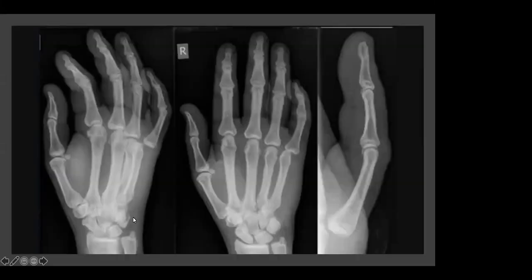So again, here, I'm not sure how well it projects on your screen, but we're looking at an example of joint dislocation. So this is a plain radiograph with 3 different views of the right hand. And if you look at the 5th digit, there is joint dislocation of the metacarpophalangeal joint of the 5th digit. And again, it highlights the importance of why multiple views are required. It's much more emphasized on the oblique projection rather than the lateral.